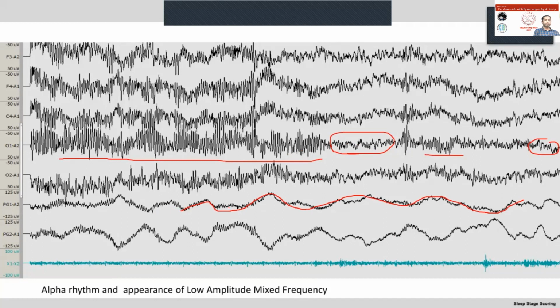Okay, and slow eye movement, I already applied that when the first deflection happens, it should be more than 500 milliseconds. So EMG again, this is the wake stage, should be higher, and this stage, since it is covering more than 50% of the total epoch, if you see here, and this part. So I think it is covering most of 50% of the epoch. So this stage is actually wake stage, but is in transition to N1.